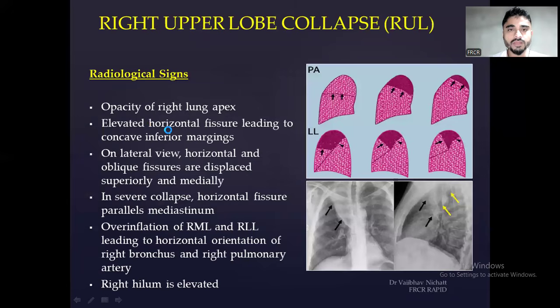Now we'll be discussing each and every collapse lobe by lobe. So first, right upper lobe collapse.